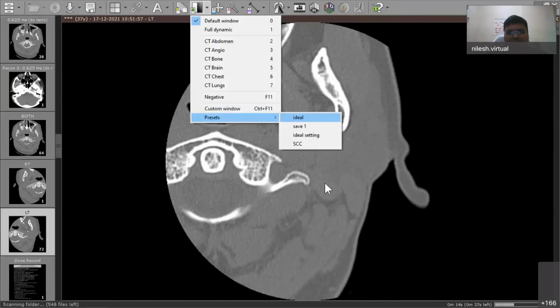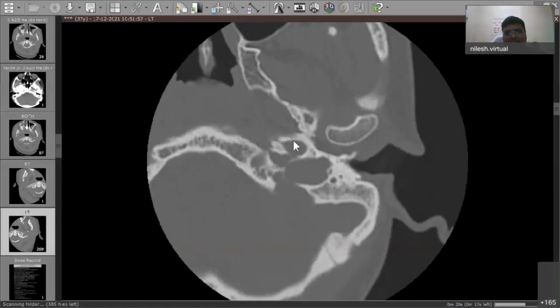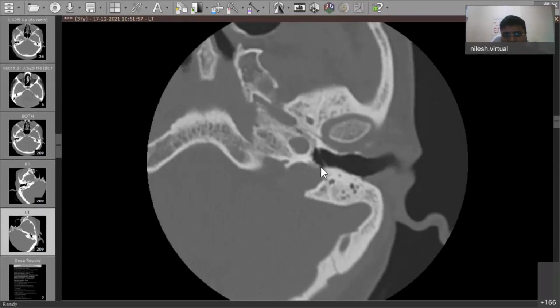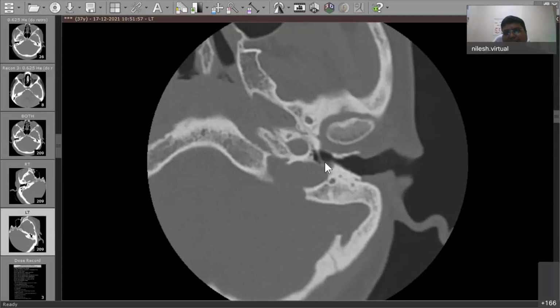We want to see the jugular bulb, so we can go even from down to up. So you can see the internal carotid artery, the jugulocarotid septum or crotch. You can see the pars nervosa, the pars venosa, and then when you are coming up, what you are seeing here. See the jugular bulb, laterally it is dehiscent, it is attached to the tympanic annulus and it has crossed over the tympanic annulus when you are going down, and it is lying somewhere in the medial most part of the bony external auditory canal. So this jugular bulb is dehiscent exactly in the inferior part of the tympanic annulus.